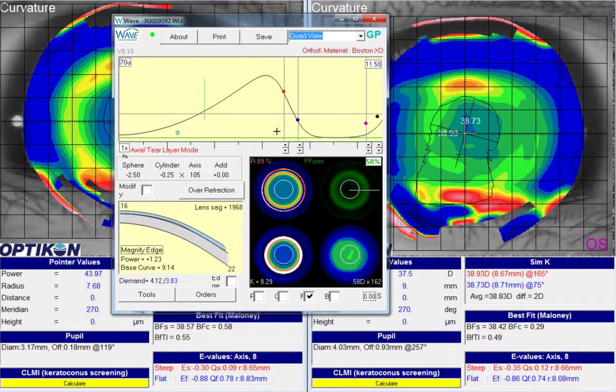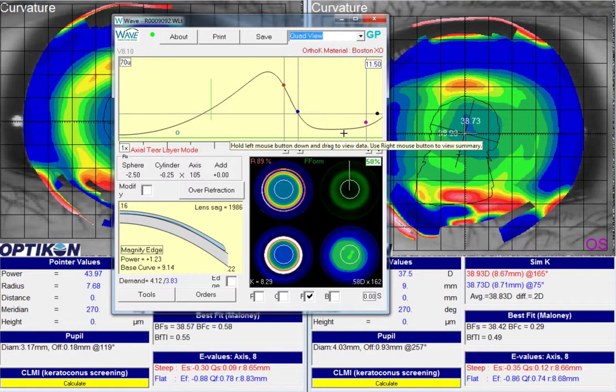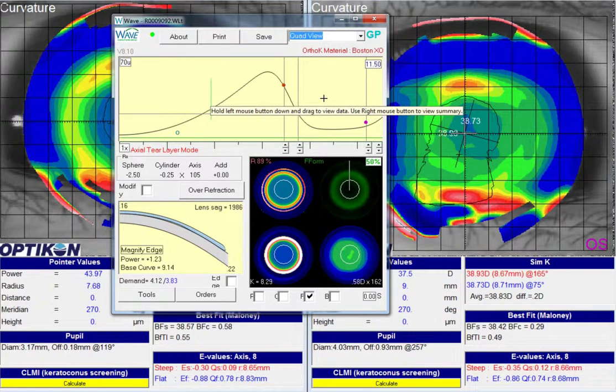So we have a larger lens, larger OZ, and then a little bit of change in the periphery and the vertical meridian, blending turned back on. I think this lens should stay well centered on the cornea, give the patient a larger treatment zone to help with the glare, and we are also taking a measure to make sure we don't overcorrect the corneal toricity. I would make the same type of lens for the left eye. Hopefully that will get your patient seeing a little bit better with better quality vision. Hope this helps.